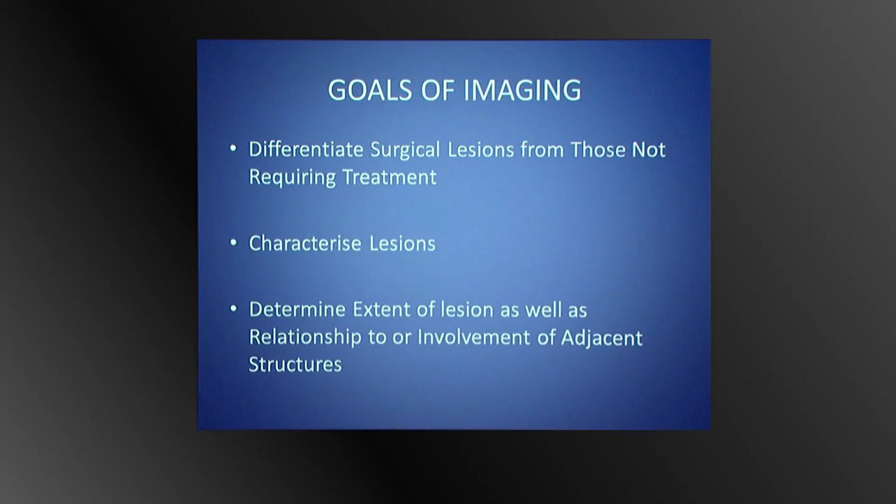But anyway, from our point of view, we have to get it right, because the last thing we want to do is send a surgeon in if they don't need to. So the starting point and the most important point is probably to differentiate surgical lesions from the so-called leave me alone, or lesions that don't need treatment. Having decided that it does need treatment, and they will need treatment because these lesions tend to be expansile, and as we've already seen, they're sort of important structures around there.